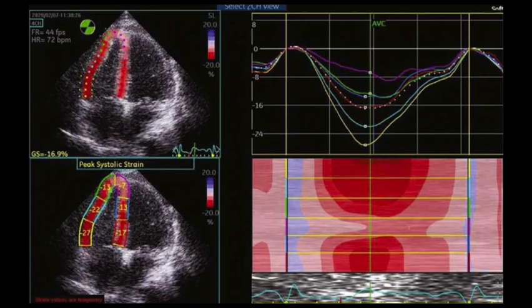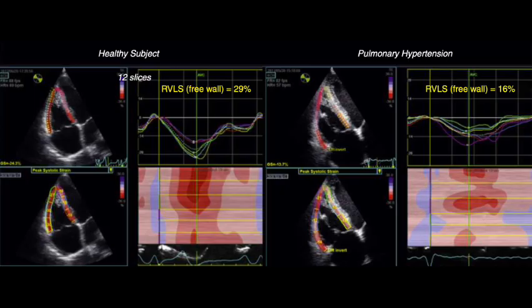Why? No idea? Okay. So remember, the septal wall is shared by the LV and the RV. So if you want pure RV function, a lot of people believe that you should only use the free wall value. Then we have one good example, this gentleman as well, of reasons why you should ignore the LV. And we'll show you later.